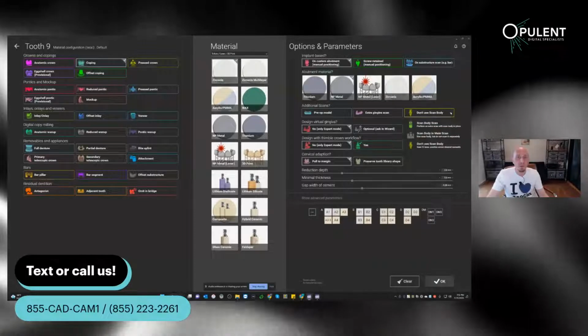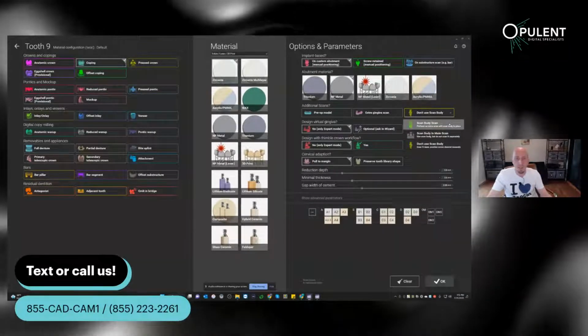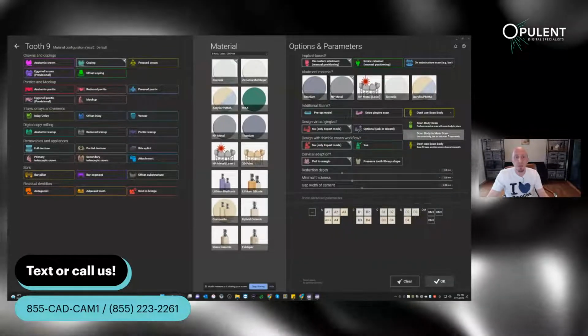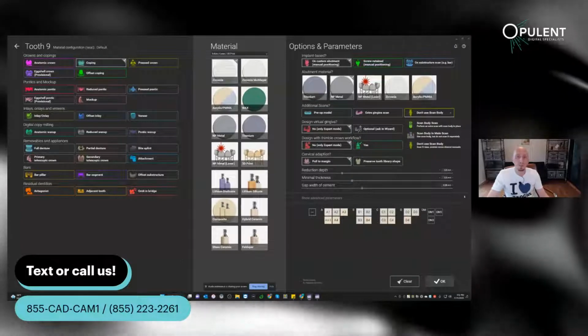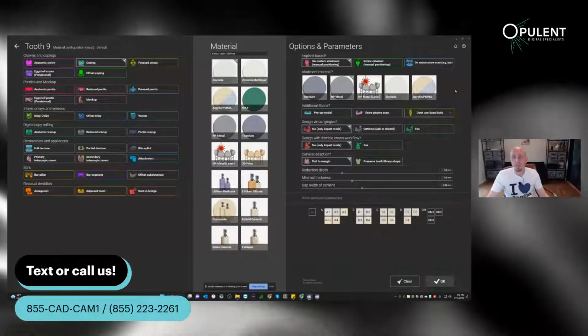And you can further down here select scan body scan if you have that, scan body in main scan, so that Exocad would then automatically subtract the scan marker, the scan body, from your scan data. Or if you say don't use scan body, which is the selection here, you're doing that manual positioning.